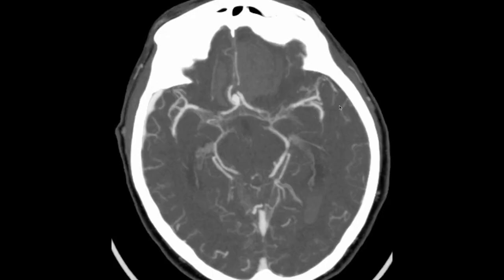It was done in this patient, and you can see that the patient had indeed developed a traumatic pseudoaneurysm close to the ACOM and where the A2 segments of the anterior cerebral arteries are. It typically again happens close to the falx or close to the tentorium, because during the trauma mechanism, those arteries get sheared basically against that dural folding, and that's the way that the traumatic pseudoaneurysms develop. Now we see here another pattern of intracranial hemorrhage in the setting of trauma, and it's diffuse axonal injury.